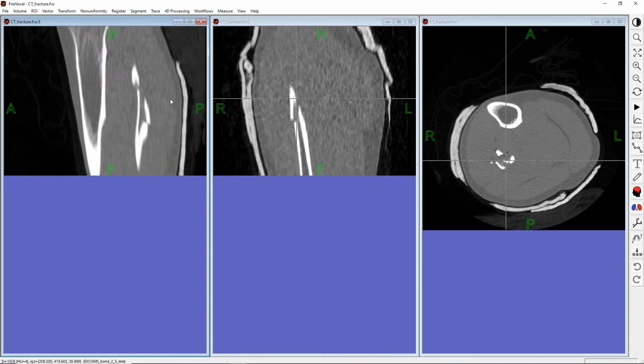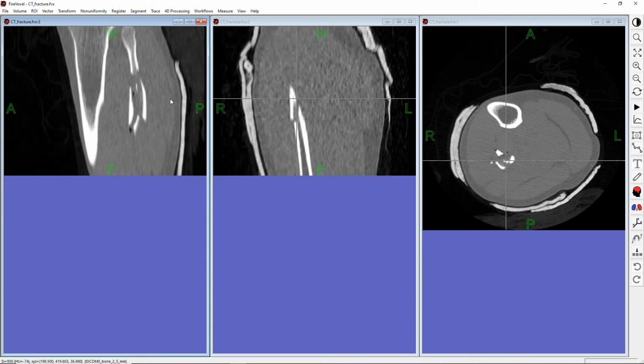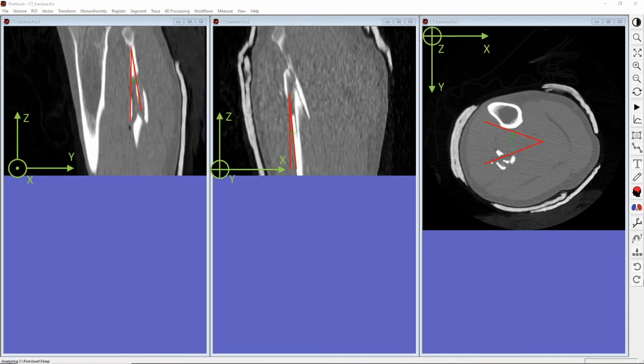We can rotate this image in 3 dimensions for a better alignment. We can again draw sectors in XY, XZ, and YZ planes to estimate the angles of rotation. We have previously determined that we need to rotate this image by -10 degrees about the x-axis, 5 degrees about the y-axis, and 40 degrees about the z-axis.